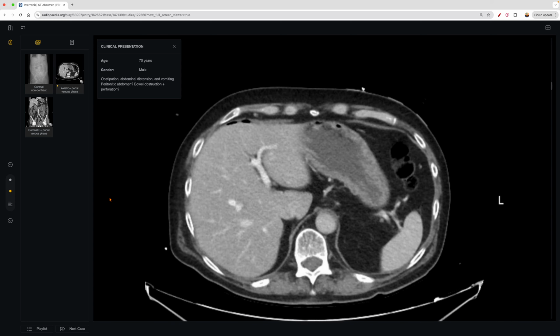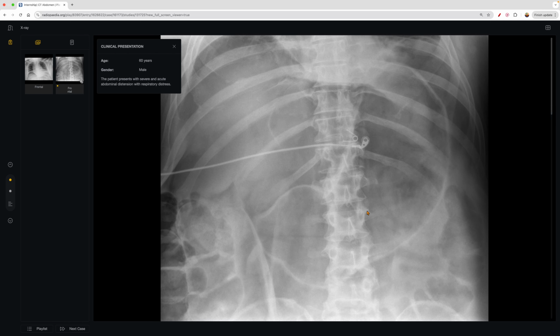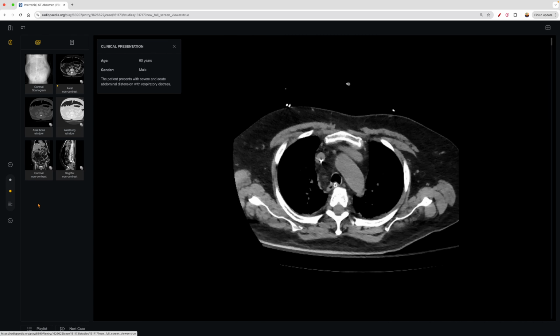And if you have the opportunity, you would certainly want to put on the lung window because it allows you to isolate the soft tissue structures and really focus on the air accumulating. And so we'll see another case of the same idea. So for this chest radiograph, you can see this right diaphragm is not only elevated, but there seems to be an increased lucency just inferior to it, indicative of pneumoperitoneum. And then just more air within the abdomen here, more so within the structures, the viscera.